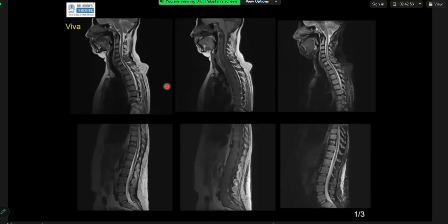So other than this, I do also note in the upper thoracic, that would be T3, I also note a similar higher signal. In the lower thoracic and lumbar vertebra, I can see uniformly normal signals returning from the vertebral bodies and intervertebral discs.